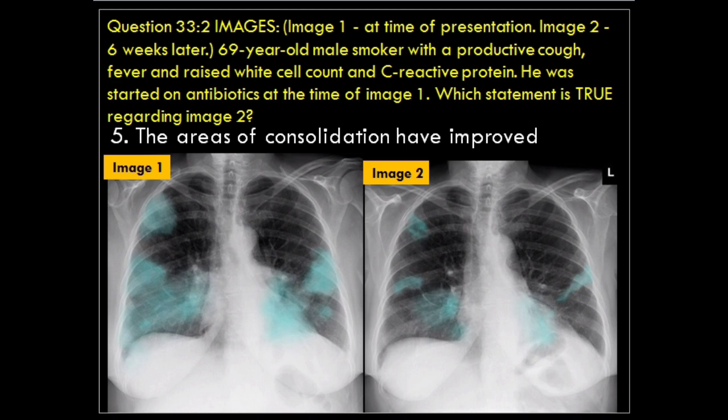No radiological feature is ever diagnostic of a pneumonia. Even if pneumonia was considered to be the diagnosis, in this case the distribution is not that of a lobar pneumonia, as the multiple areas of abnormality are not in a specific lobe of the lungs.